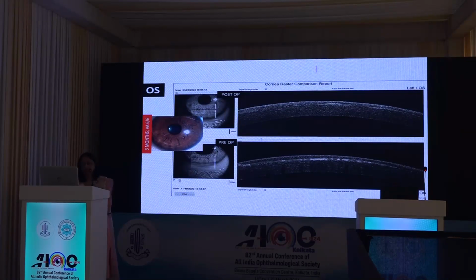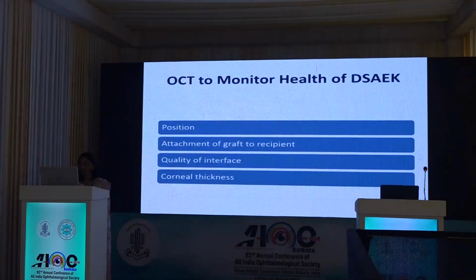And similarly, this is another patient in which you can see scattered epithelial nests throughout, but post-removal, the cornea was clear. So you can monitor the response to the therapy afterwards by doing AS-OCT.